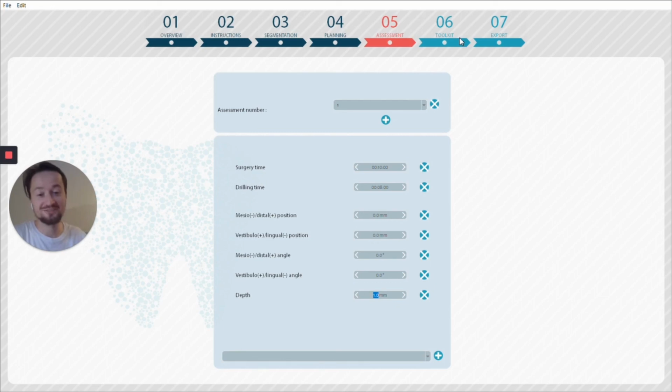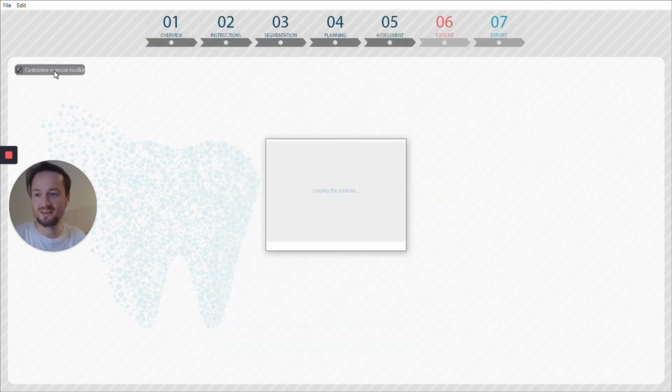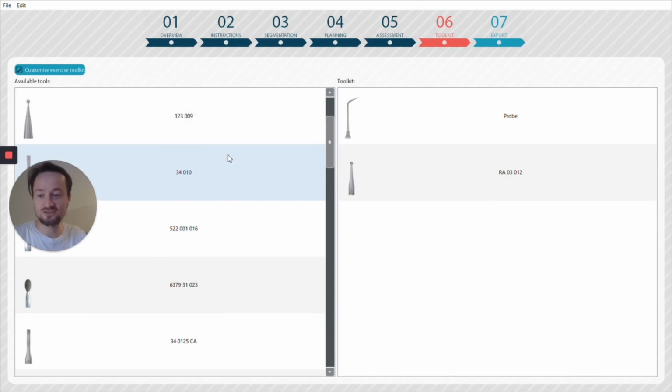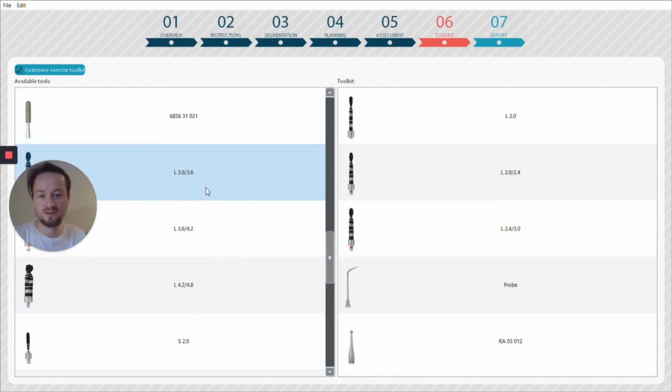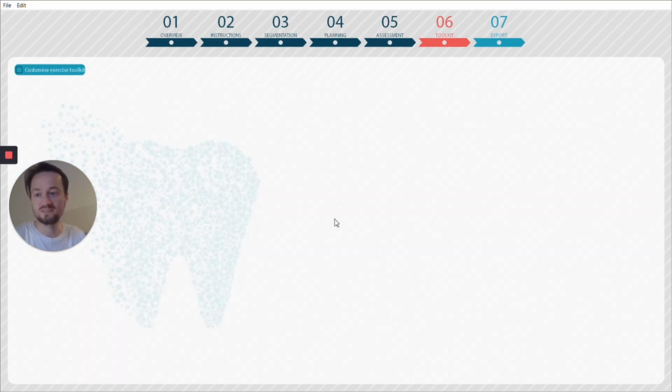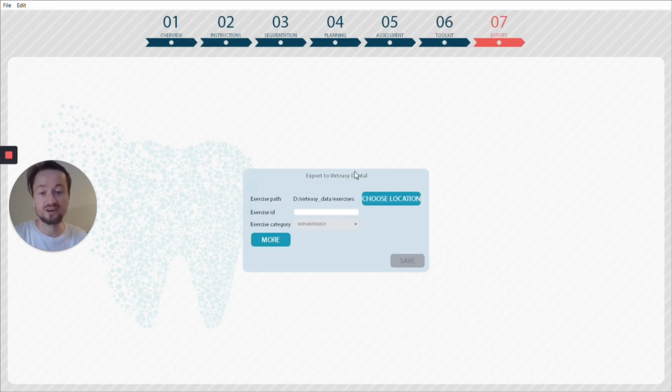So my second exercise, implantology, and if you want to control the smoothing, finally click save. That's going to create the DICOM data. It's creating the haptic solid, that's the part you touch, and it's writing everything to its correct file. It puts across the lesson notes, the images, and now, just like that, everything's on our server, and all the simulators can use the exercise.